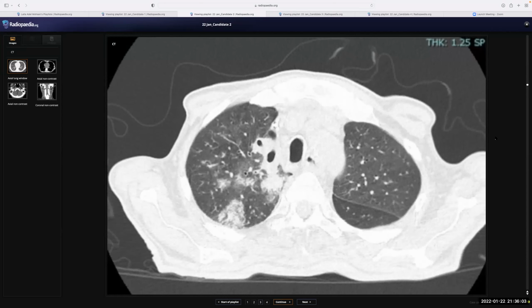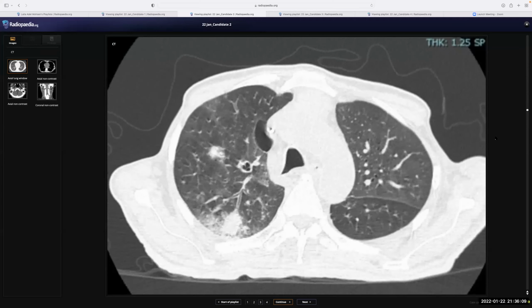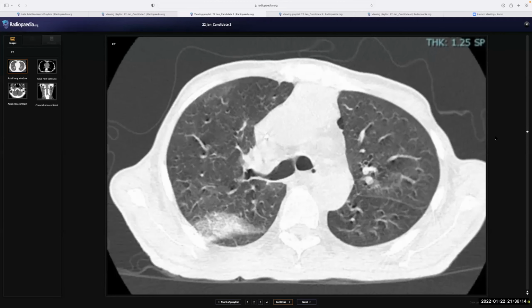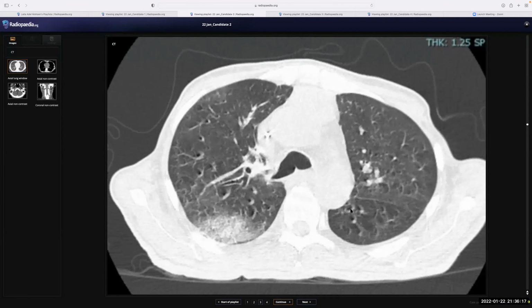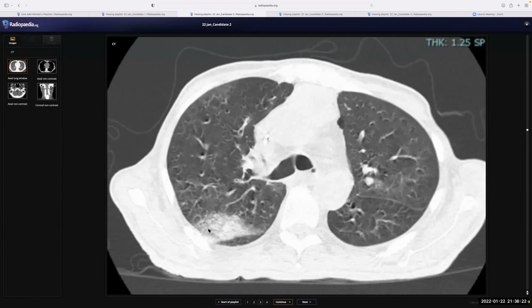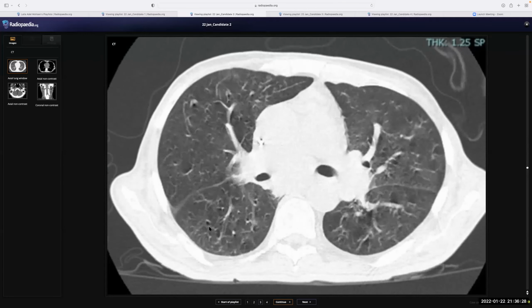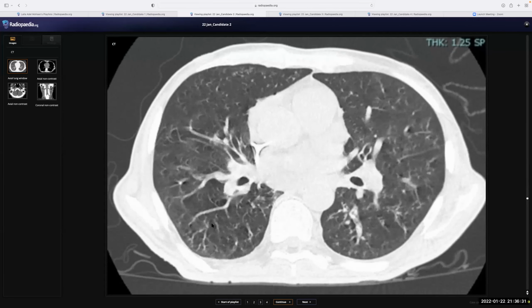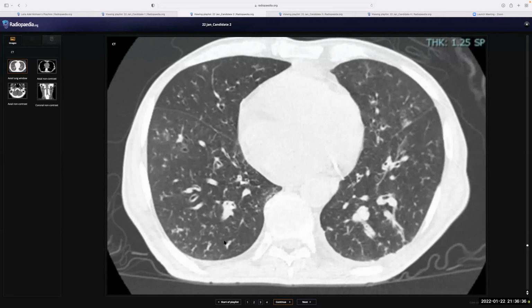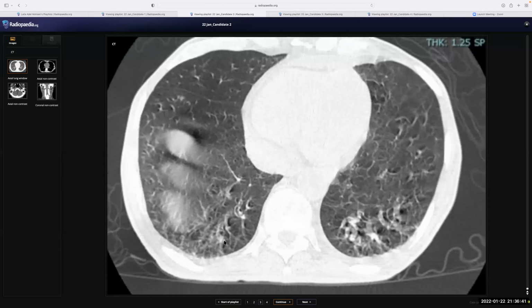They are multiple. They are surrounded by ground glass opacification as well. Up till now, they are predominantly in the right lung. I can also see an area of ground glass opacification in the upper lobe with no cavitation here. There are subtle bronchiectatic changes as well. And there seem to be tree-in-bud and miliary nodules as I progress towards the lung bases.